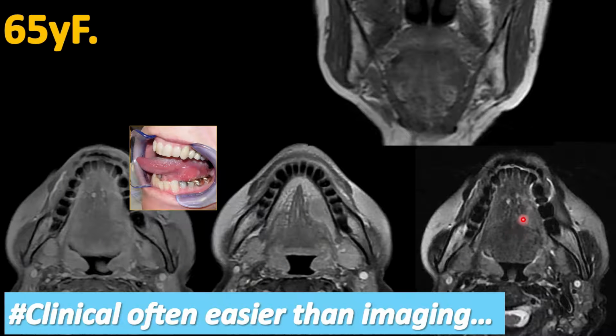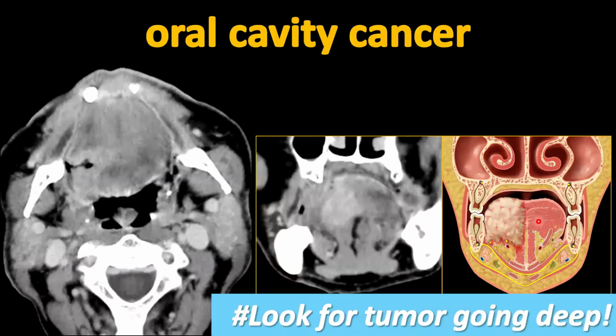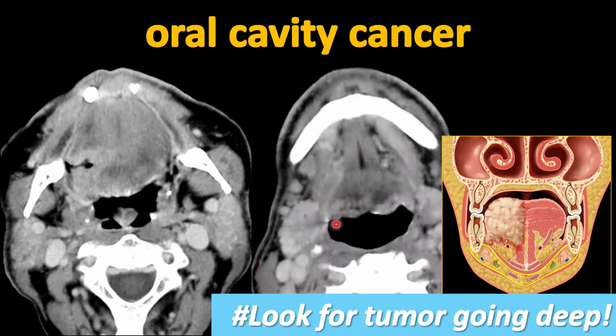But something that is arising from the lateral aspect of the tongue here, remember we're in the body of the tongue rather than the floor of the mouth. This is a little easier to see on CT. This one has pretty moderate enhancement. I always get coronal plane images. You can see the ulceration here. And what you're looking for with the coronal particularly is to see if there is deep invasion.